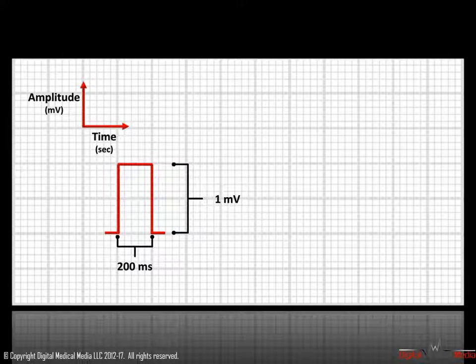If the 12-lead ECG has been recorded using the standard recording principles established years ago, then this standardization signal should be 2 large boxes tall and 1 large box wide. In other words, the gain is set to normal and the speed of the recording paper is set to 25 millimeters per second. If this standardization signal is 2 large boxes wide, then the paper has been set to run at twice the normal speed, and all your measurements of duration and time must be adjusted.